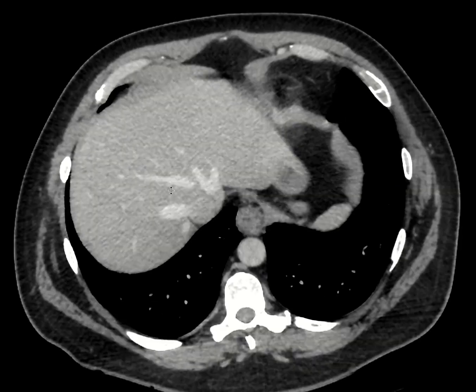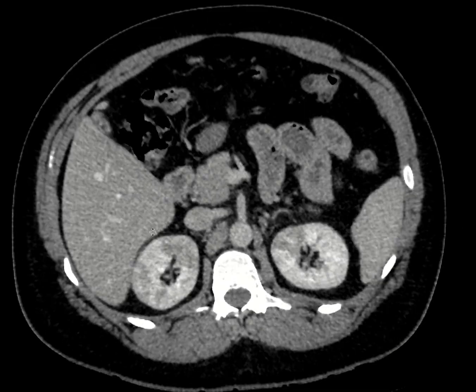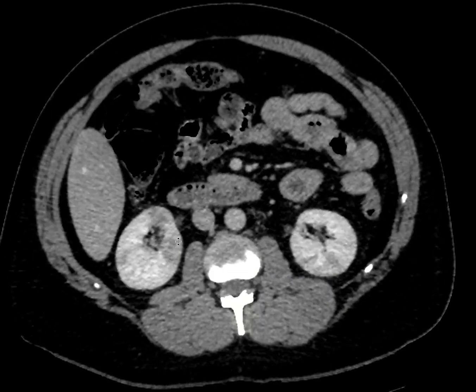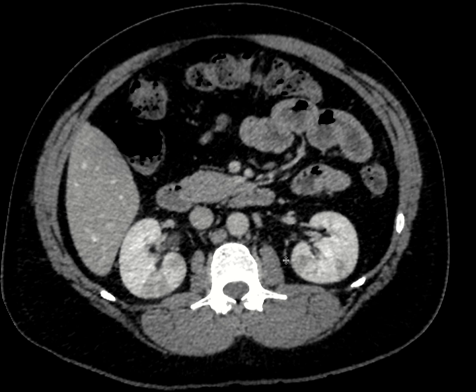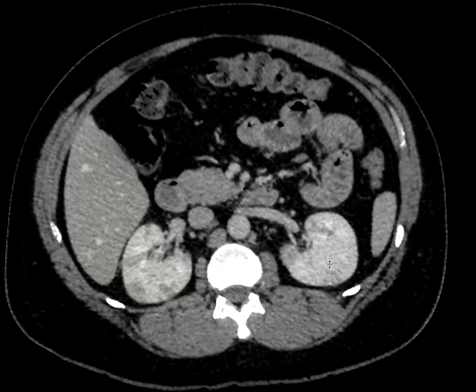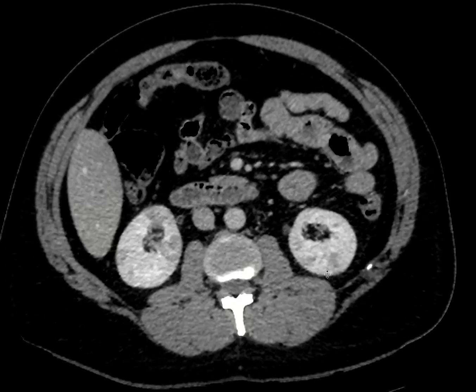Here's a CT that was performed of the abdomen and pelvis. The dominant abnormality seen on this particular imaging study are these striated nephrograms bilaterally. You can see normally when you have this phase of contrast, this is a nephrographic phase in which the contrast is evenly distributed throughout the kidney.